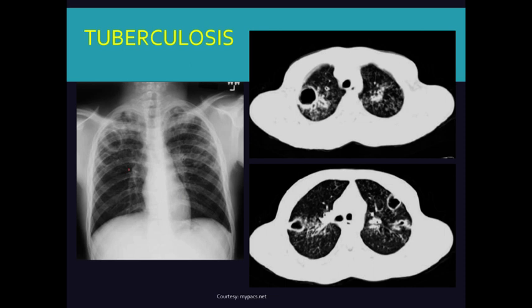So here's an example of tuberculosis in a patient's lungs. Lung tissue should be lucent. We should have some of this branching pattern here. All this is okay. This is all blood vessels and bronchi. So it comes from the trachea and all that, as well as the pulmonary trunk. And that's okay. So all this stuff in the inferior aspect is fine.